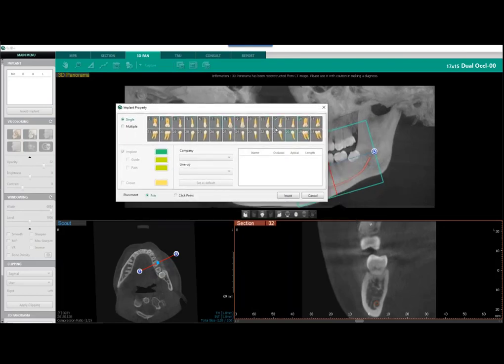And we have our tooth list. We can place a single implant or multiple. And within the coming weeks, especially next week, we're going to delve more into this implant planning window. And then the following week, look at a lot more features of specifically the implant planning, adding crowns, guide and path, etc. So implant planning, we're going to say we're on tooth number 19.